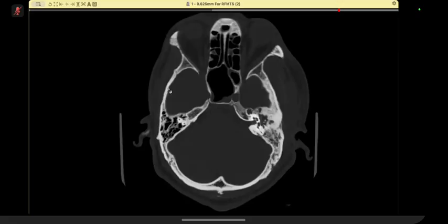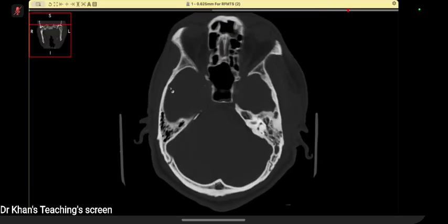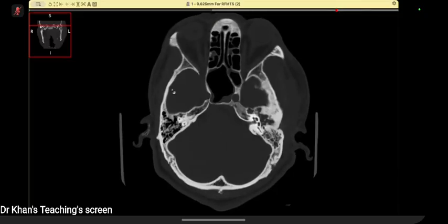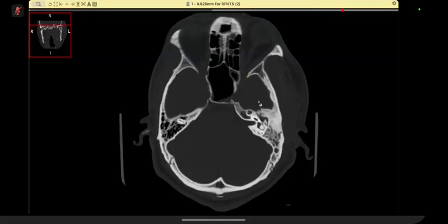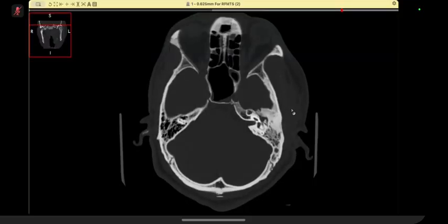Please remember in head and neck radiology, and this is true for paranasal sinuses also, it should be your routine that though routine scans are not done with contrast, you must see the soft tissue window. And then it is legitimate to ask for contrast or MR, whatever the scenario is. So she did very well because she asked for that window.